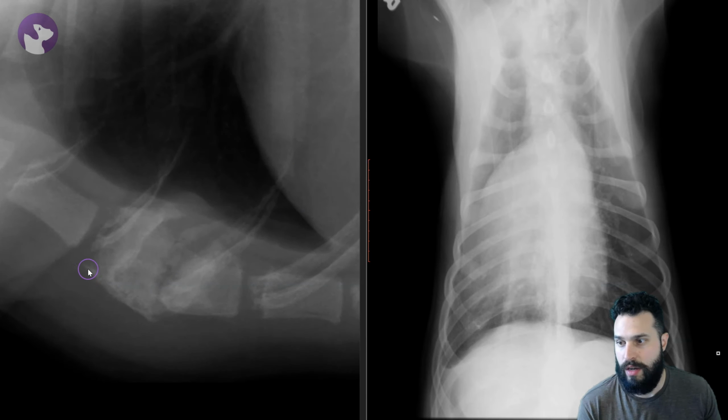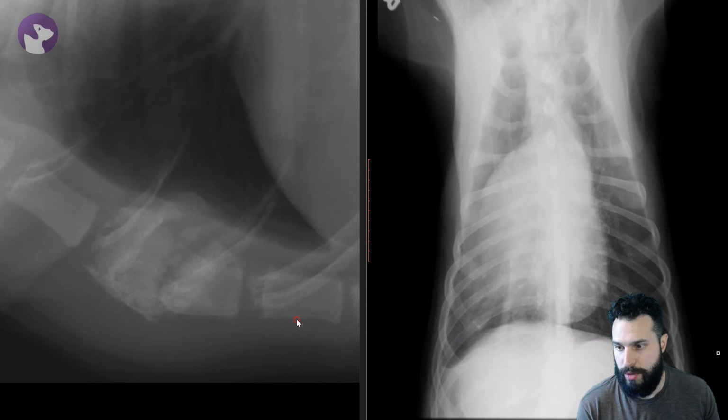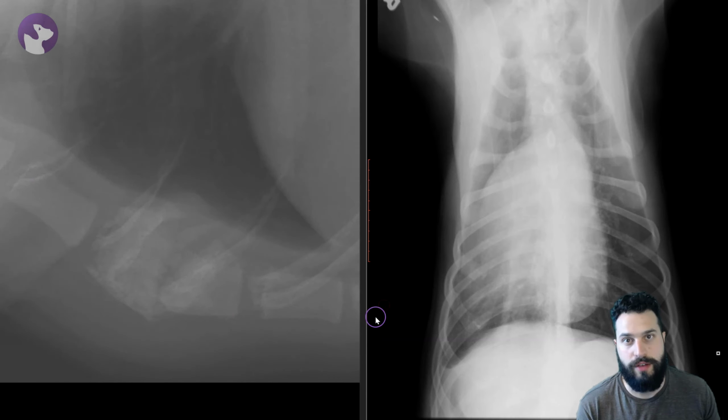So we've got osseous proliferation along the ventral margin, along the sternebral end plates, and there's collapse of this intersternebral space between the third and fourth sternebrae. A little bit of soft tissue swelling subtly extends dorsally there, and we can start to see some of that soft tissue swelling that's noted clinically along the ventral margin here, if we window level to be able to see that really fully.